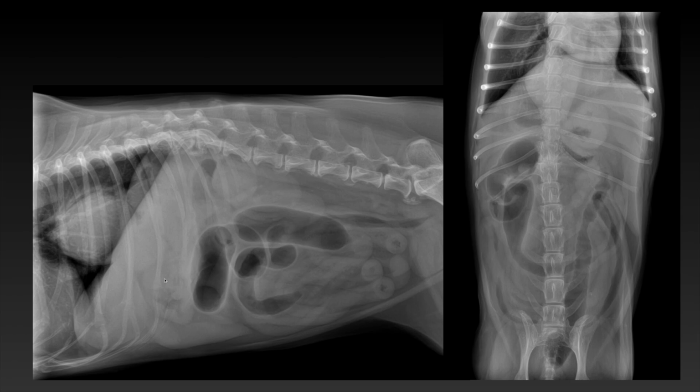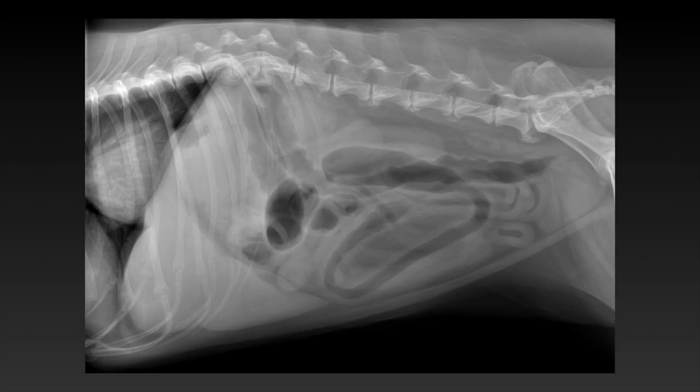Only small parts of the stomach are visible in the images where the lesion is larger. So there's some part of the stomach seen here and there, and its contour is continuous with the soft tissue opaque lesion in the midline. We see this also in the other projection. So here is the soft tissue opaque lesion, which is partly superimposed with the diaphragm, and the remaining stomach is probably somewhere here. This could be antrum.